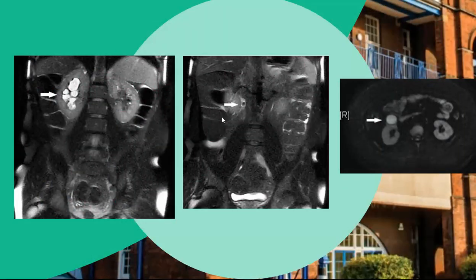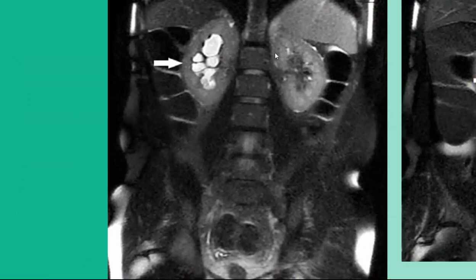MRI sequences can provide valuable information in the workup for acute kidney injury. They may be particularly useful for patients who are pregnant, young, or for whom iodinated contrast is contraindicated. Here is a T2 weighted image of the kidneys where fluid is bright. You can see hydronephrosis with this caliectasia. Compare it to the left.